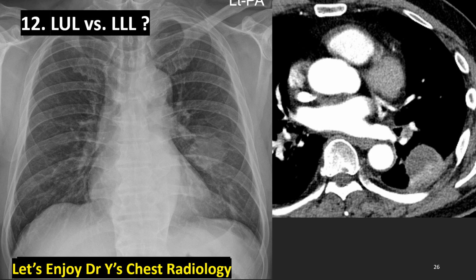The last image, the last frontal radiograph of another old man, a 4 cm mass in the left middle lung zone. Where is it? Left upper lobe or left lower lobe? Not in contact with the heart, far from the aortic border. Actually, it's not possible in this case to locate where the tumor lobe is. The answer on the axial contrast enhanced CT is the left lower lobe.